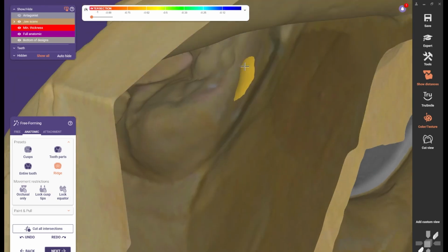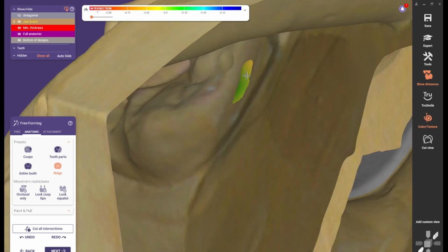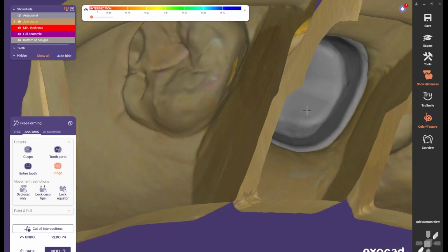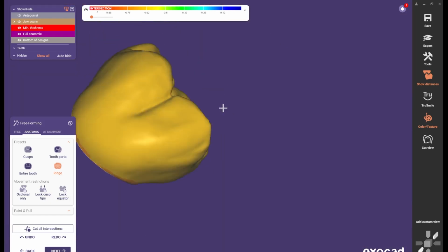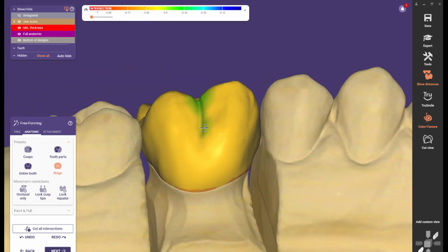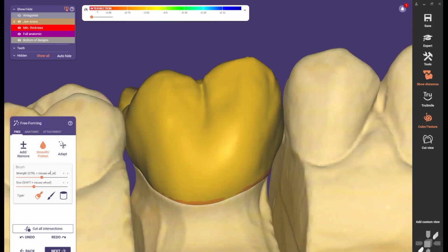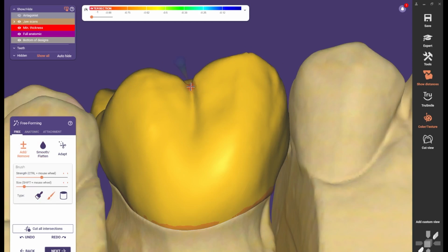It's a nice shortcut to know. So you want a surface, but you don't want it to bulge out. Okay, that being done, I'm just gonna shorten this little line here because it's way too obvious and we don't need that. This is gonna be plenty.